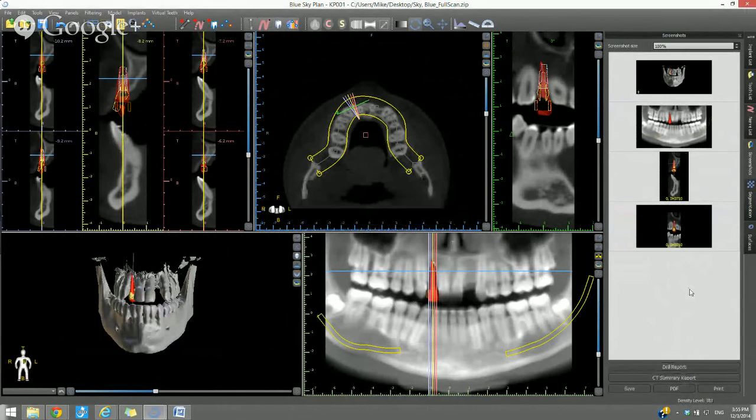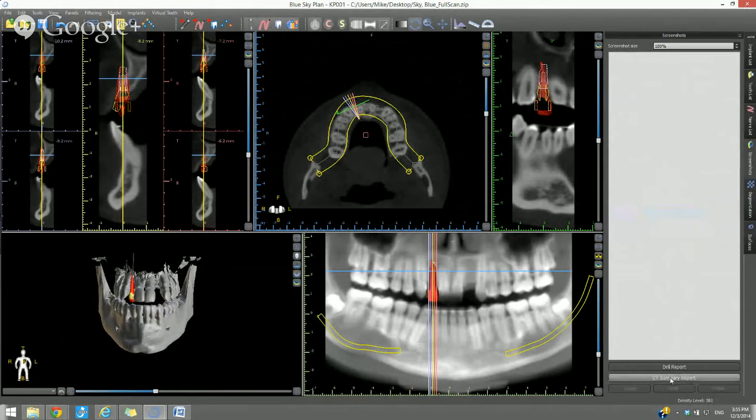And what this does for us is it basically generates a hardwired report into the system. That's ideal for analyzing the CT scan. If you're a scan center or if you're a dentist and you just want to get your traditional report from the CT scanner, it will show you the different slices, the different cross-section slices that you usually view, and it just creates that report automatically.